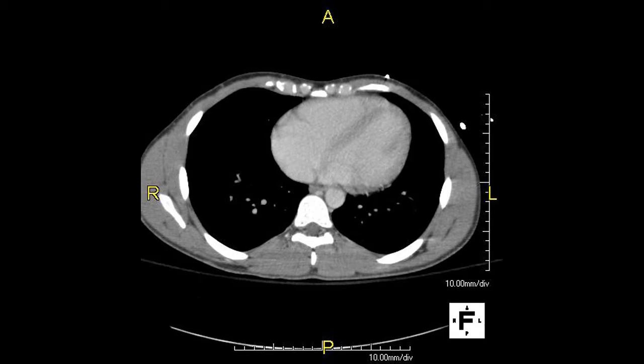The answer is no, because this is the heart we can actually see that I'll circle quickly here in blue. And you should be able to recognize this from your last unit of anatomy, as well as the axial heart video I hoped you watched previously to this one. I'll scroll through a few more slides until we've actually entered the abdomen.